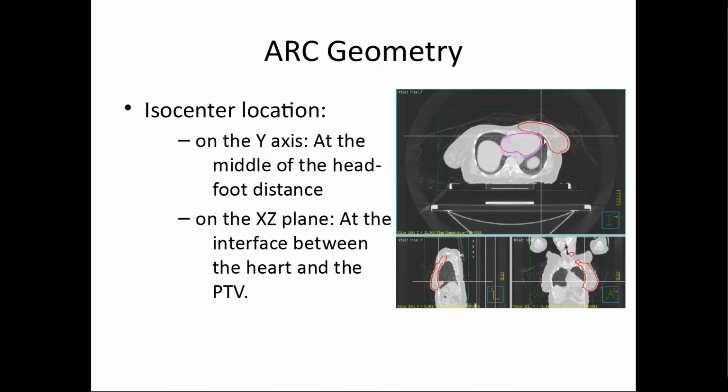So this is where your dosimetry will benefit the most from the non-divergence of the beam.